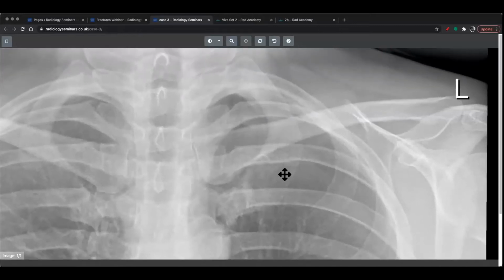Now, a consultant I used to train with was very good at it. She told me that if you're ever unsure, you draw a box and only concentrate on that box, and then go to the other side and concentrate on that box and see if there's a different style situation, right? And actually, when you see on the other side, you can see that there are linear opacities going all the way to the edge, but there's not much in the way of linear opacities going off.